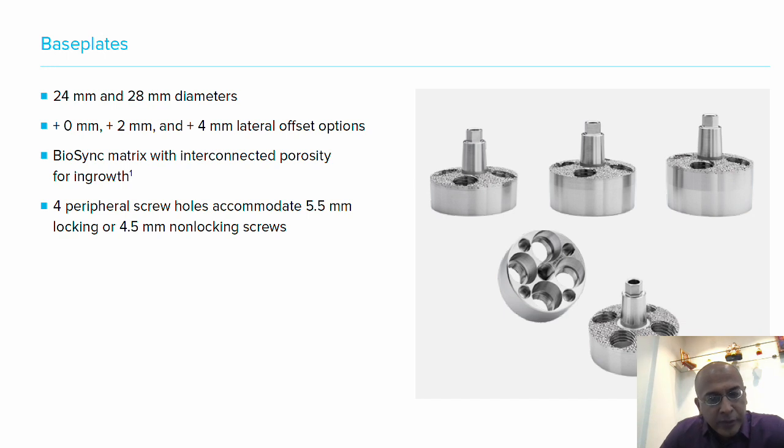There are different options in this Arthrex system. It's not like I do only the Arthrex. I'm a frequent user of the Tornier system and the Blueprint planning software as well. I'm also interested in the Acumed Reflect. So I do use multiple systems. This is basically to tell you about the Arthrex system.